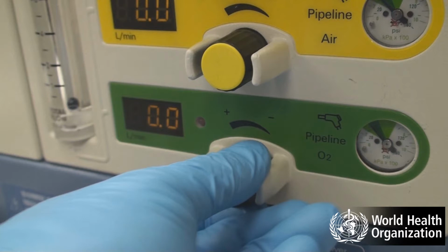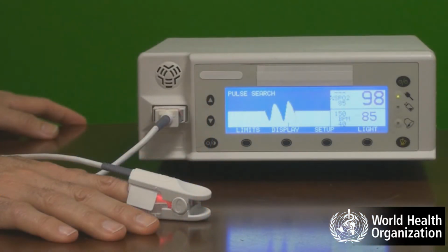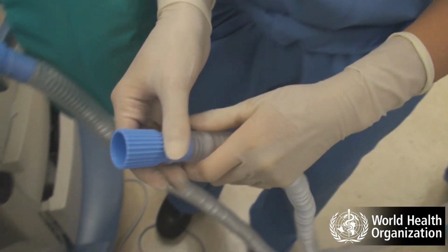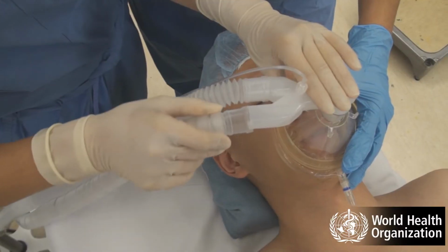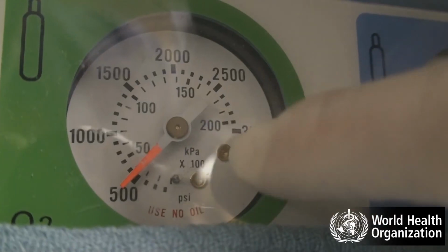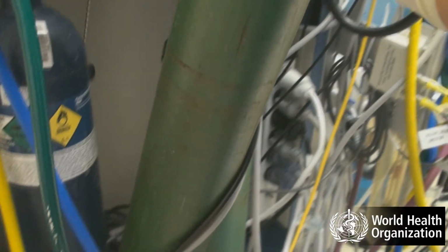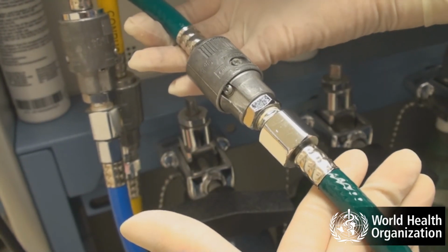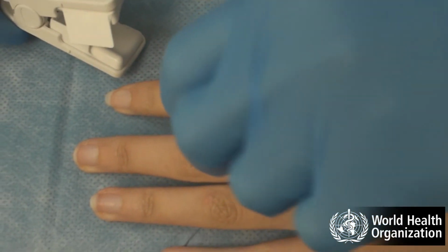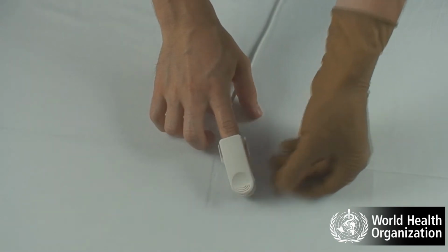E. Is the equipment working properly? Is there a problem with the oxygen delivery system? Does the oximeter show an adequate pulse signal? If there is a problem with the equipment, check for obstruction or disconnection of the breathing circuit or tracheal tube. Check that the oxygen cylinder is not empty. Check that the oxygen concentrator is working properly. Check that the central hospital oxygen supply is working properly. Change the probe to another site. Check that it is working properly by trying it on your own finger.